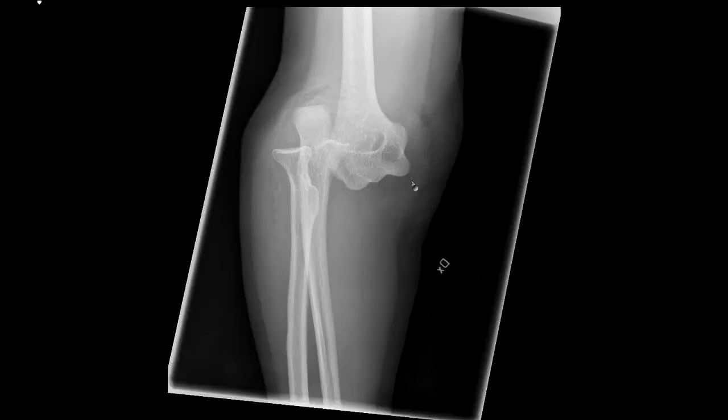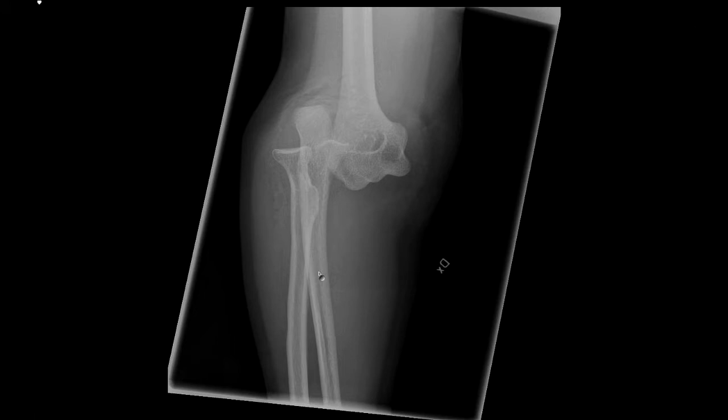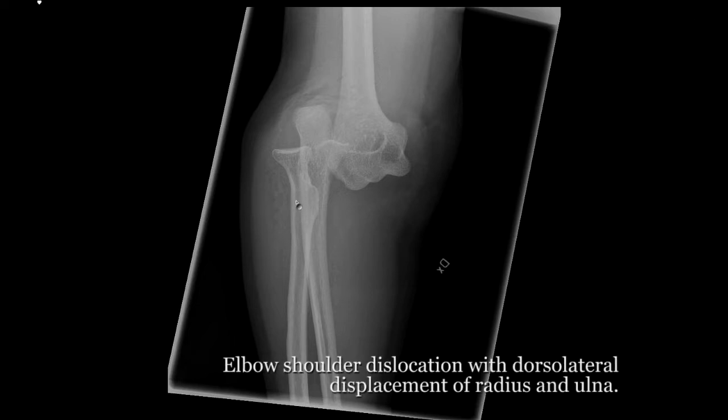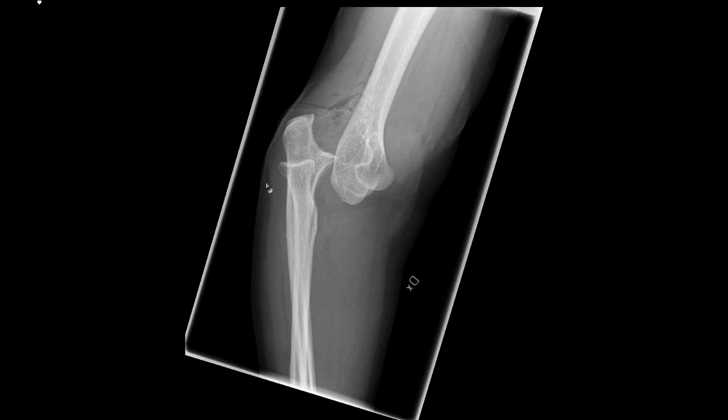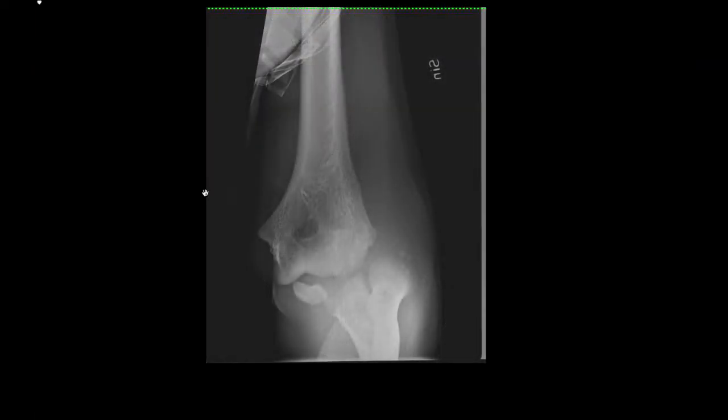And use all your angles. So in this patient, the distal bones, which means the ulna and the radius, have been dislocated radially. And this is basically lateral dislocation, because when it comes to dislocation, you're always reporting on the distal part of the joint or the fracture. Another image just to show you the consequences and the extent of this luxation. So I want to show you one more luxation. Here, guys, is another luxation, and this looks very horrible.